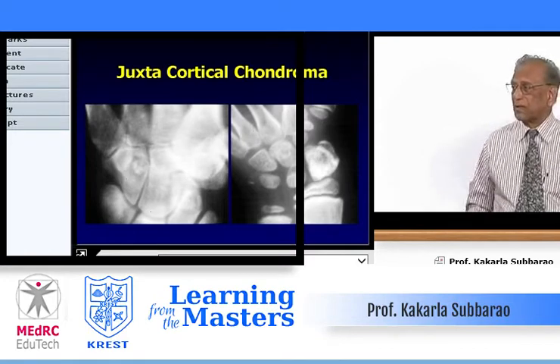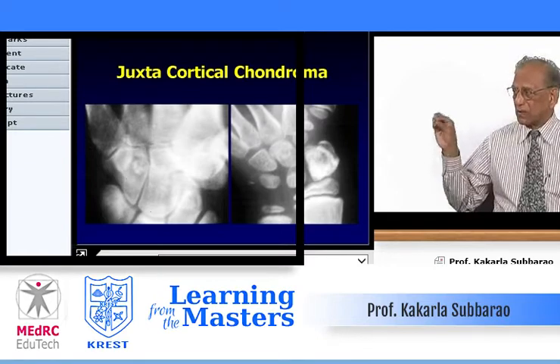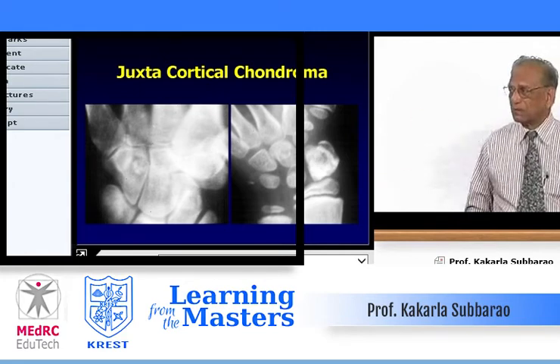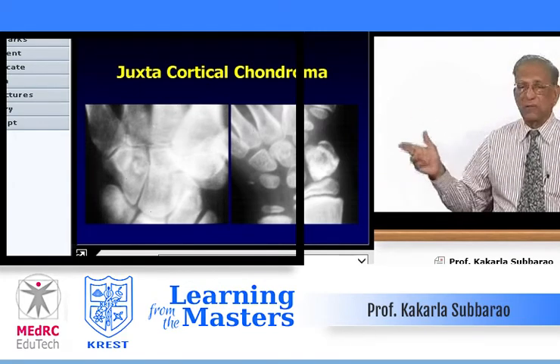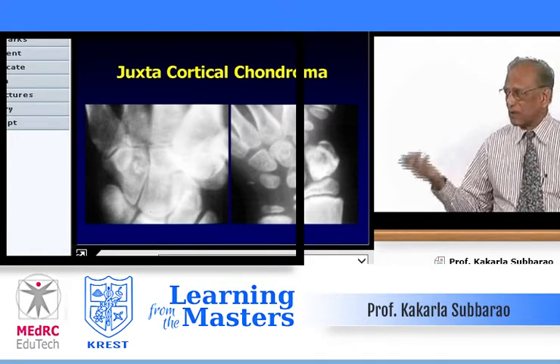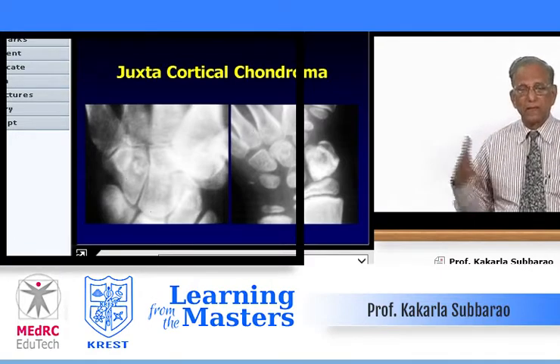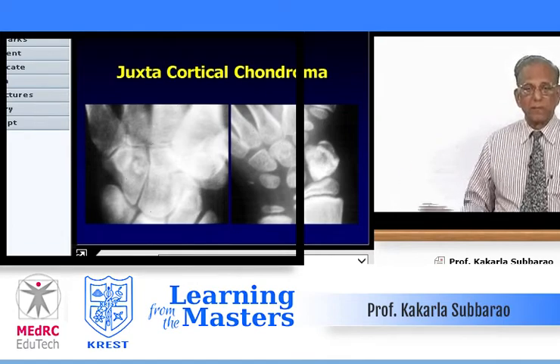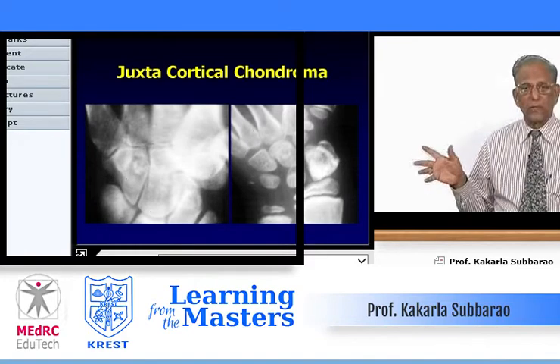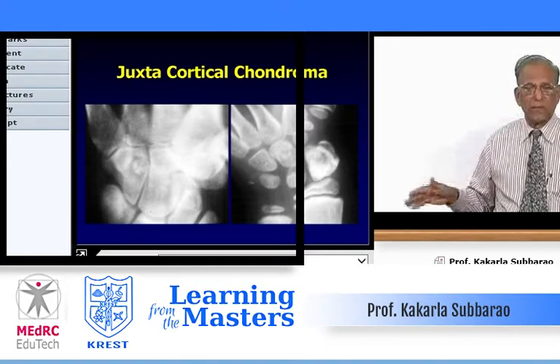One on your right side is peculiar. It's a child again, the epiphyses are not closed, but there is an extra calcification in the scaphoid, extra bone. And it's not calcification, it looks like ossification, part of it at least. What do you think of the lesion? There is no calcific mass to think of a chondromatous lesion, but still it is Trevor's disease, epiphyseal chondroma. This is an unusual case, but you have to think of that. Generally, they occur unilaterally on one side, particularly on the lateral side.